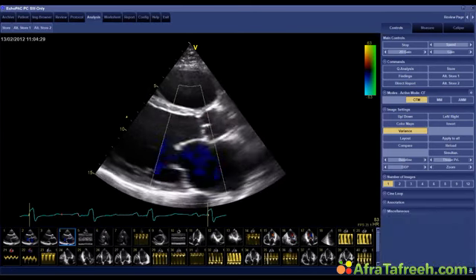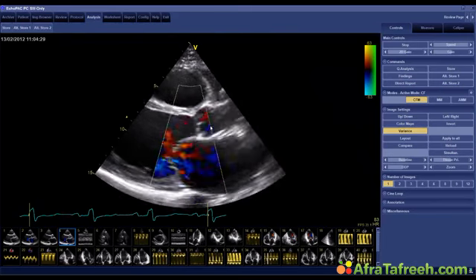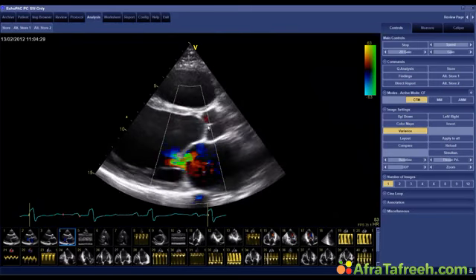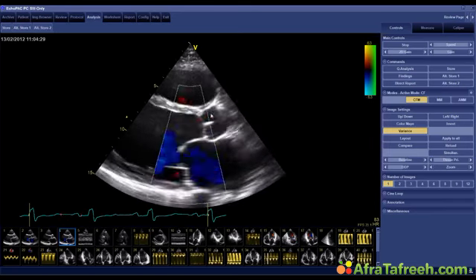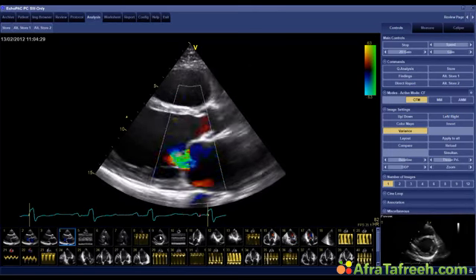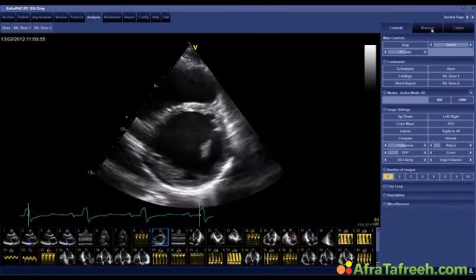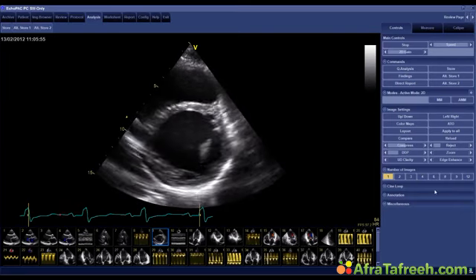Okay. If you look closely, you can actually see that the aortic valve does not open all the way towards the wall, and that there seems to be abbreviated opening of the aortic valve, which is probably caused by reduced flow across the aortic valve. It's also understandable why the patient has reduced left ventricular flow across the aortic valve, because he has poor left ventricular function. So I'm not going to ask this question. This is probably much too easy.